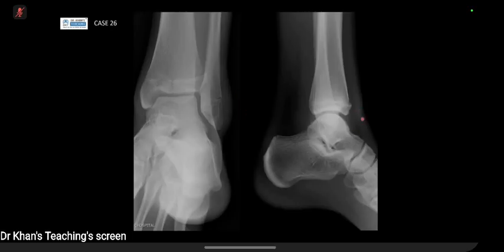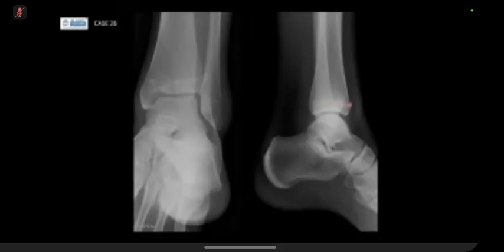Same goes for joint effusion. So you're seeing bulging of the anterior capsule and bulging of the posterior capsule. So there's a large joint effusion. And then when you're looking at that, you're thinking of any intra-articular processes going on. It's trauma, so I won't be thinking of JIA. But if you look again closely, you're drawing contours. If you come down the metaphysis and suddenly you've got a little step here, okay? And then you wonder, yes, I know the physis can be irregular in the distal tibia, but I just wondered if there was just a little bit odd in the front bit here.